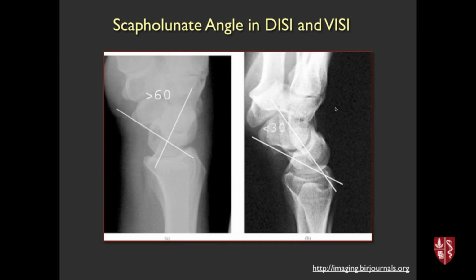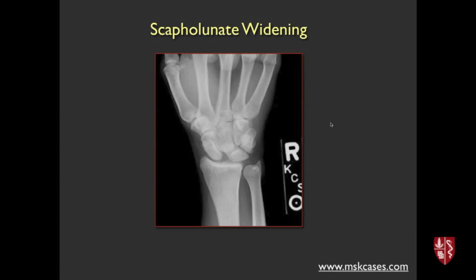Now, these are pretty advanced concepts that I wouldn't expect the first years to necessarily know, but as you get to be more senior and you're reading films on your own, it's really important to know these because you'll miss these malalignment patterns, and they're fraught with problems for the patient if you miss these malalignment patterns.